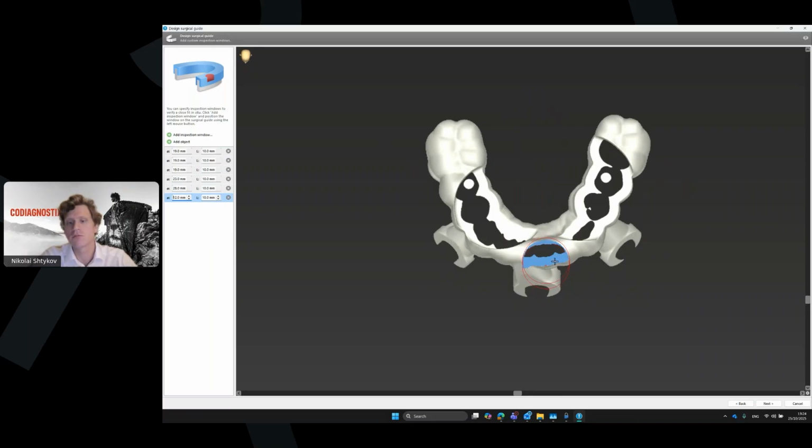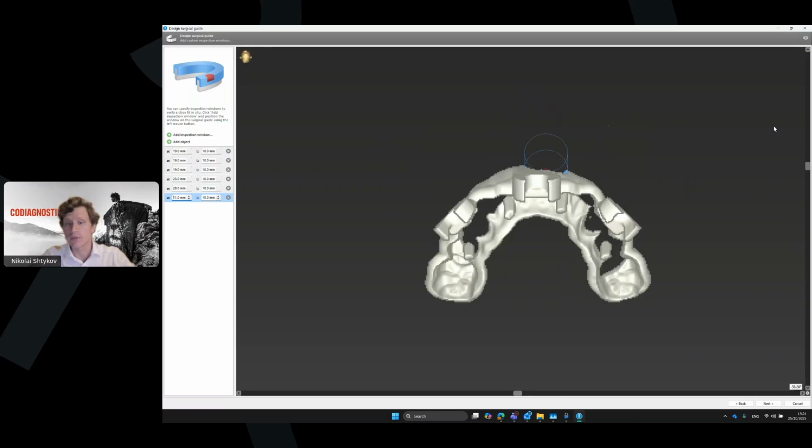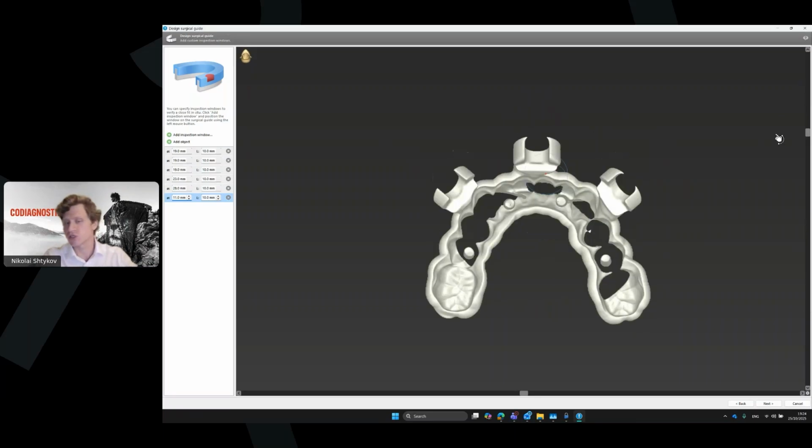No, maybe too thin. Okay, let's do it like this. And what's more, because there are some holes, and these holes, on this one, the last one I will delete. These holes, they are not following, so we need to open just one hole, maybe for the screw is okay.